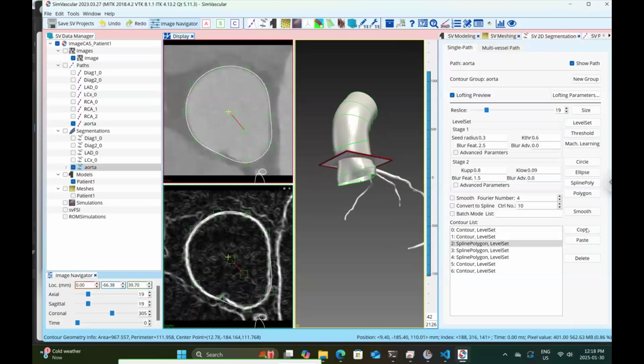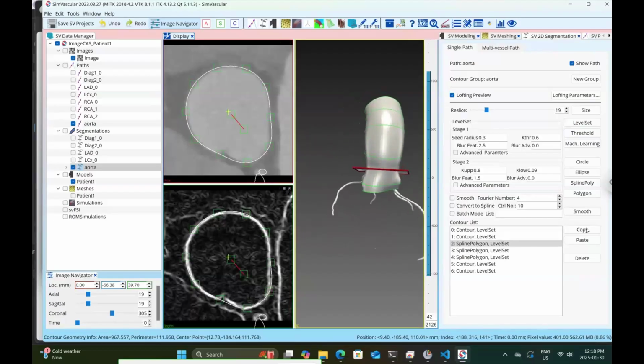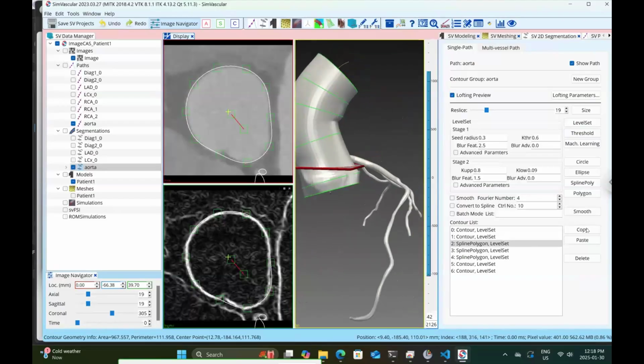Yeah, I think this is okay, right? I think that's as close as we can get, because 3D looks much nicer. So I can show you a 3D segmentation for the aorta, because the aorta is big. You can actually do a 3D segmentation.